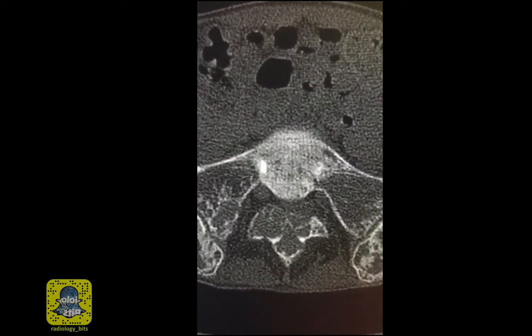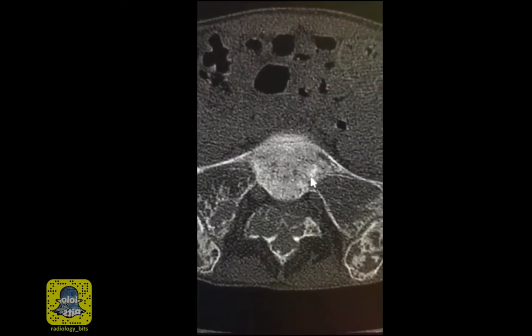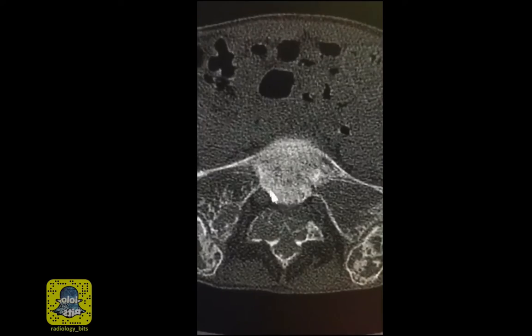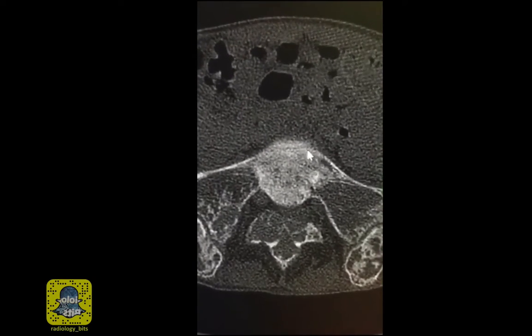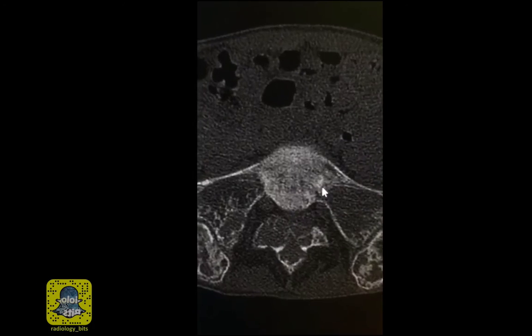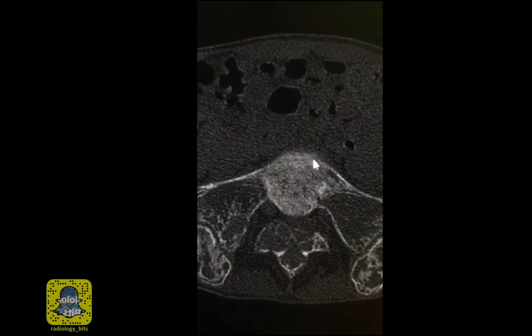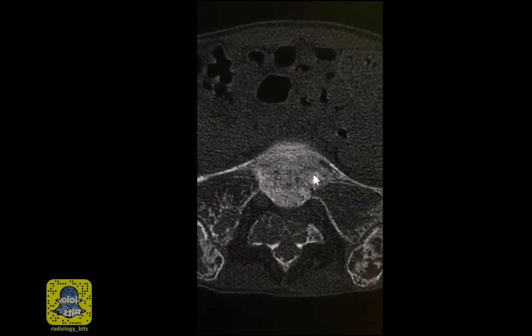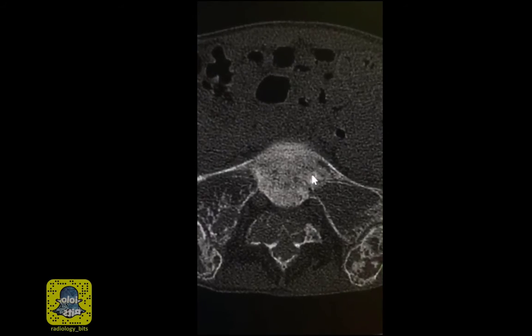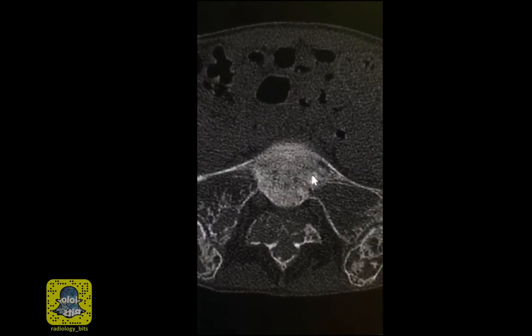Now, what explains this area of increased bone density or sclerosis? Since this is the opposite of what you expect with what we just described with hyperparathyroidism and bone mobilization, don't be surprised to see that, since this is the manifestation of renal osteodystrophy. In fact, one of the major possibilities for increased bone density diffusely is that of renal osteodystrophy.